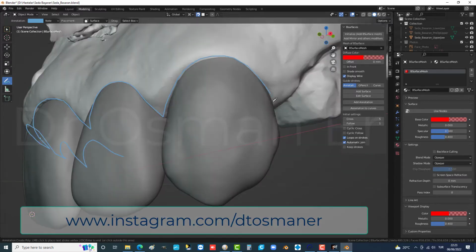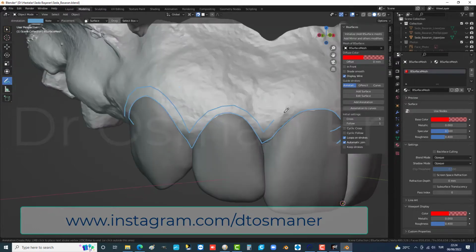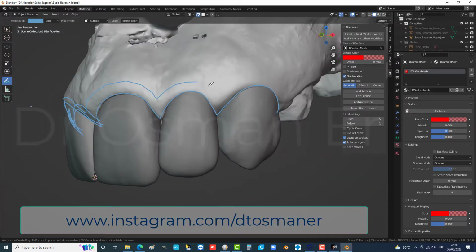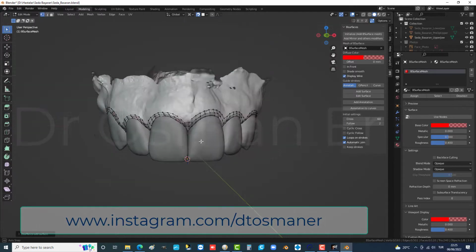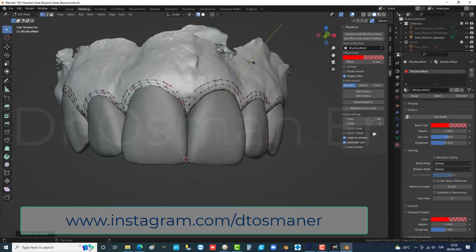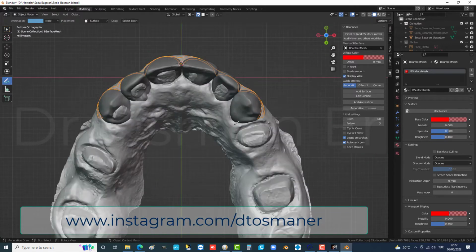While preparing the mock-up, we may need to manage the soft tissue. In order to level the gingival contours, sometimes a gingivectomy should be performed. It's much easier and more precise using a gingivectomy guide. The only thing to do is place the guide and do the surgery.